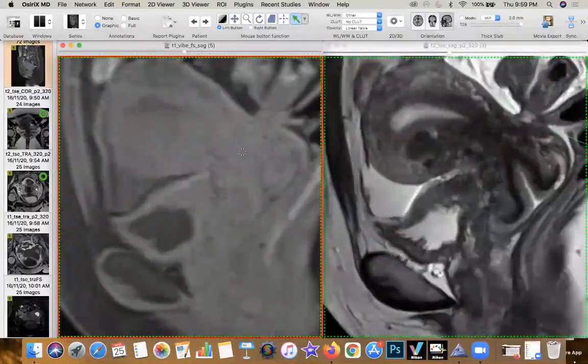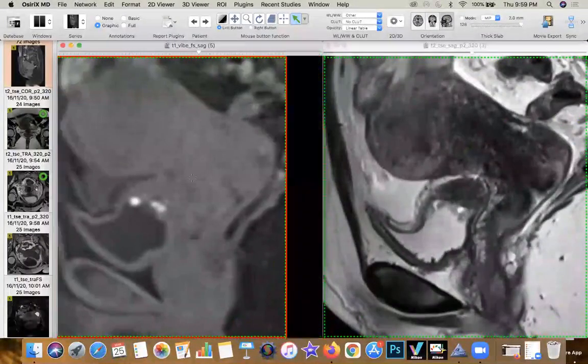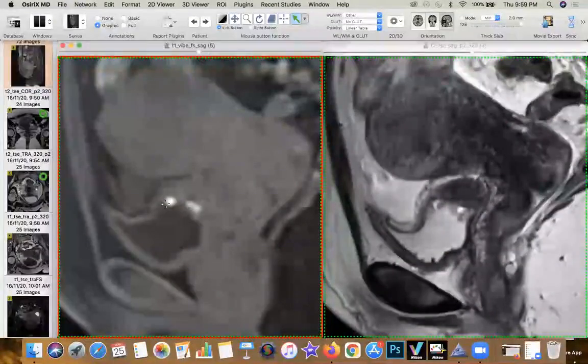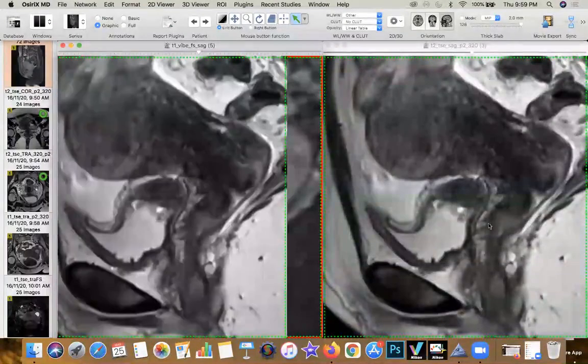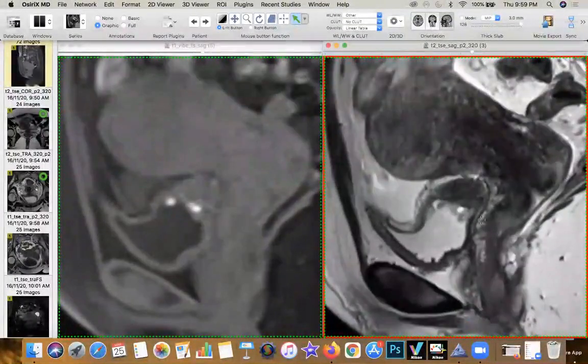Now let's move this on the T1 weighted 3D, and you can start appreciating that the disease, which was initially transmuscularis, has now gone all the way up to the mucosal surface, and you can see specks of hemorrhagic tissue within. So this represents the anterior cul-de-sac pattern of deep pelvic endometriosis. That is bladder wall involvement, uterovesical shelf getting affected.